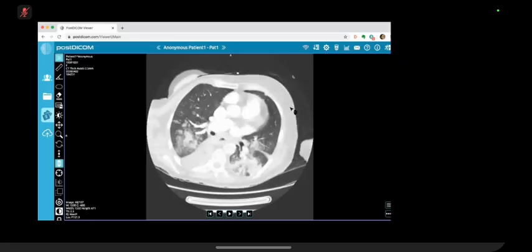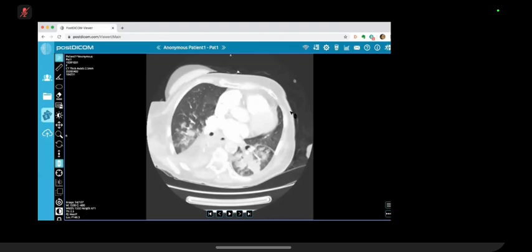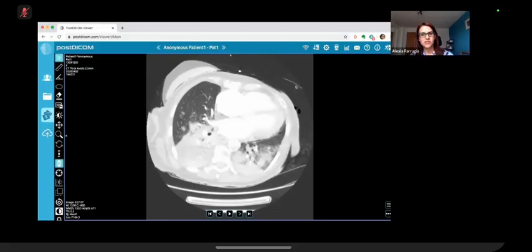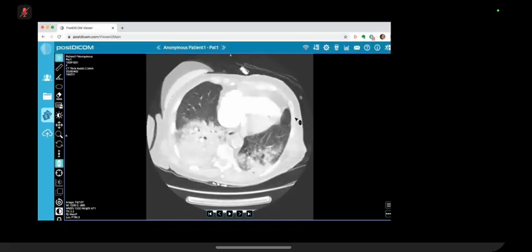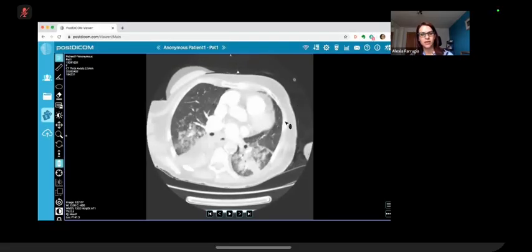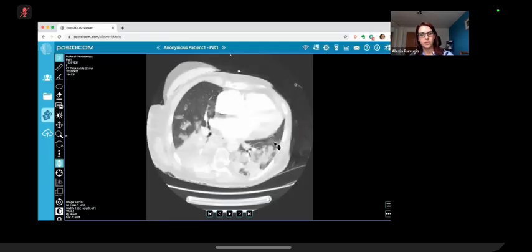Yeah. And she has a low blood pressure in hypovolemic shock. So maybe there is a complication in the femoral region, and maybe probably here pulmonary hemorrhage, maybe due to anticoagulation. This is what we were talking about before, the kind of gradient, that there is ground glass in the midline, and then it becomes more consolidative in the dependent regions.